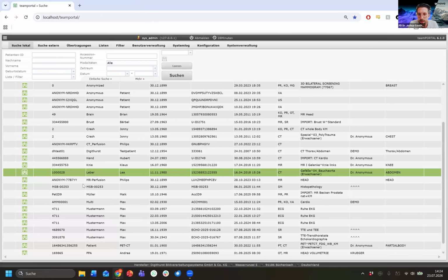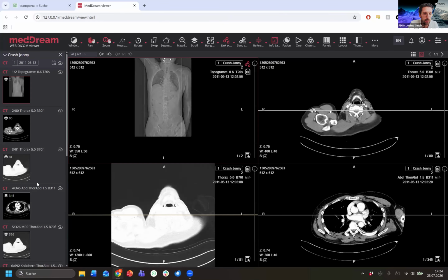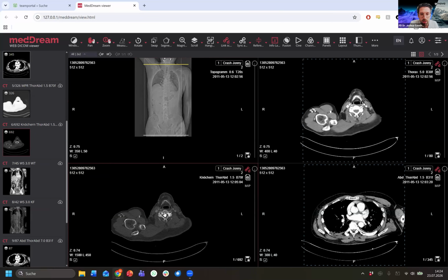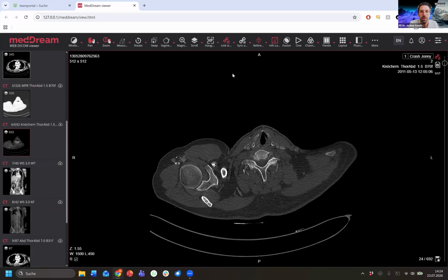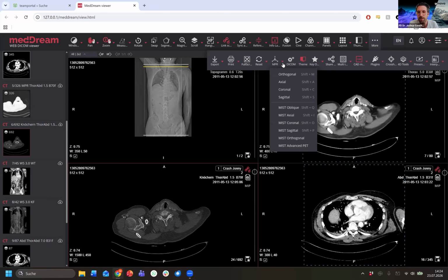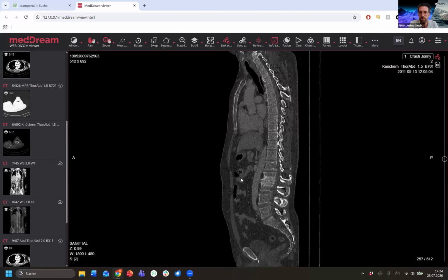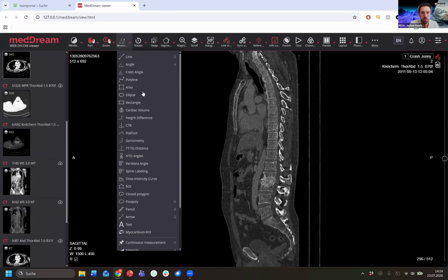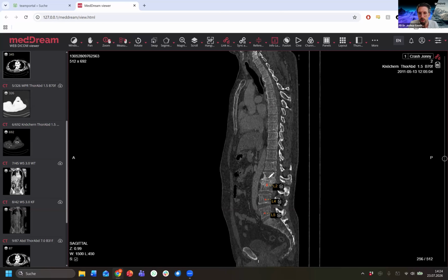One thing I want to show you, but for this we go into a bit thinner slice, which I think turned out really, really great, is the spine labeling. Raimundas unfortunately mentioned it only briefly. I think it's really great work that you did here, on par with Sectra, if I may say so. So if you reconstruct here, for example, the sagittal view of the CT, and you go into the measurements and perform the spine labeling, I'll do it right here, ascending L5, that's correct. And we go now through the spine. I'm not doing all the spine, right?